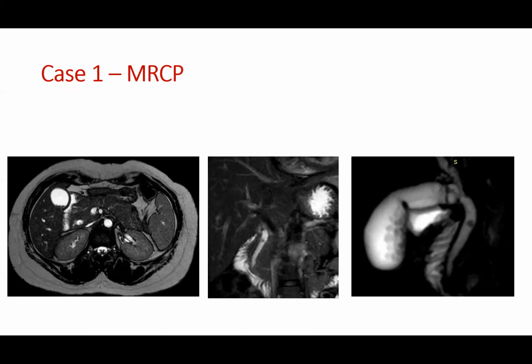Usually we do it supine, but sometimes turning the patient a little bit onto the left lateral, then the bowel shadows and everything go away from the gallbladder, and you might be able to pick up small stones. But usually you don't need to position the patient to see gallstones if they are visible, except for the ones which are lodged at the Hartmann's pouch or at the neck.